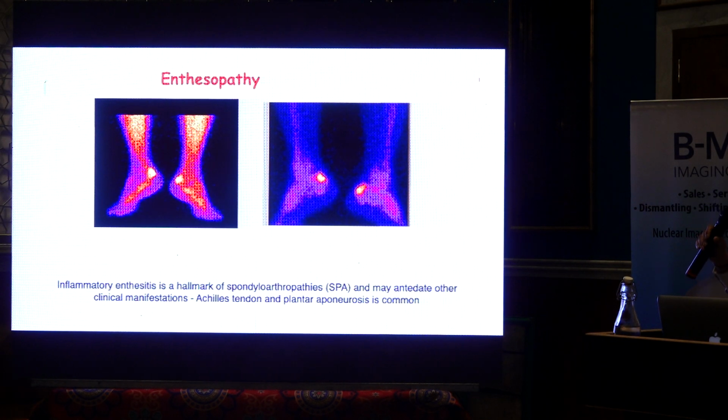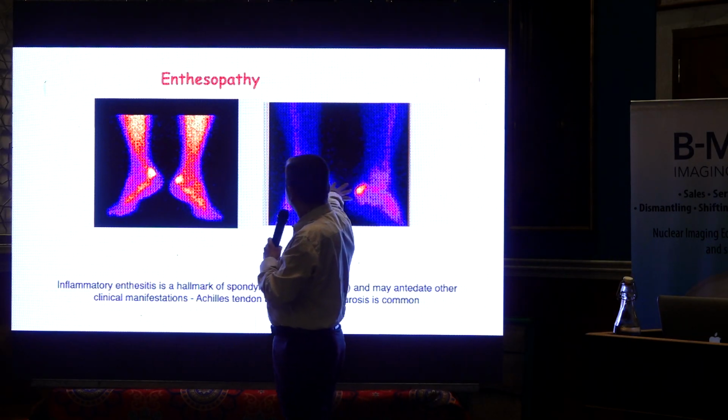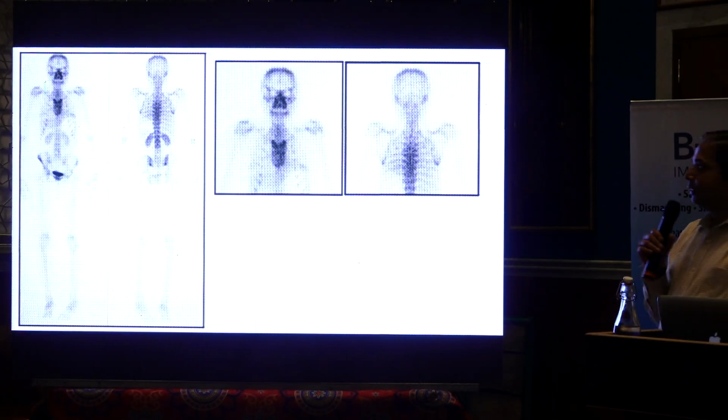The enthesopathy can be depicted very nicely, it's the tendinitis, which can be very nicely seen. This is a very interesting case.